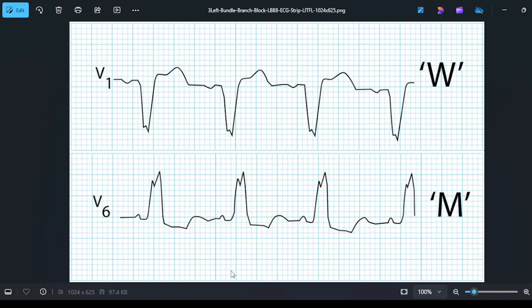So you have only one diagnosis for an ECG in the exam. If in the rhythm strip you find nothing abnormal, it looks all normal, then go for the pattern, and then go for V1 to V6. You check from V1, V2, V3.